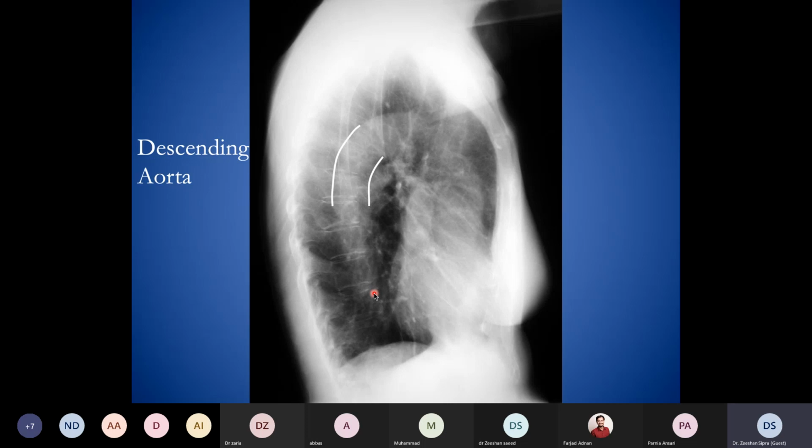Maybe you are interested in knowing the great vessels, how we judge them. The descending thoracic aorta is better evaluated on the lateral radiograph than a PA view. But just showing you the lateral radiograph anatomy first. Aortic knob. This would make a knuckle on the PA view. What is a knuckle? It is a rounded shadow of the whole of the aortic arch.